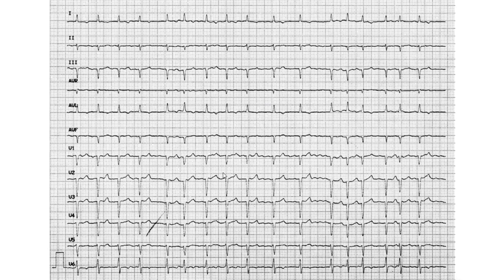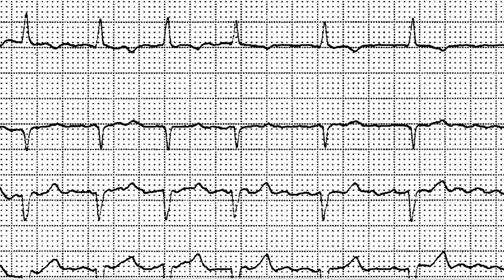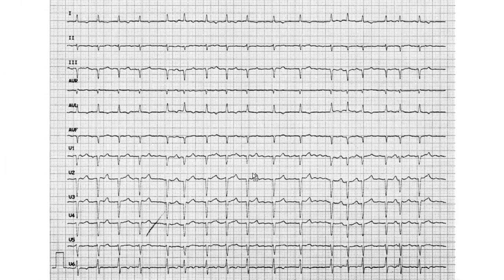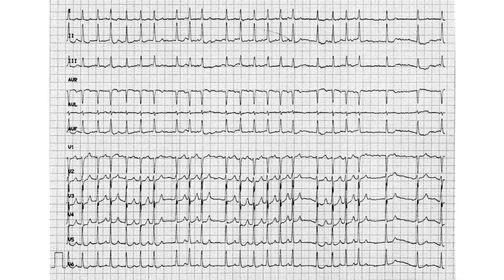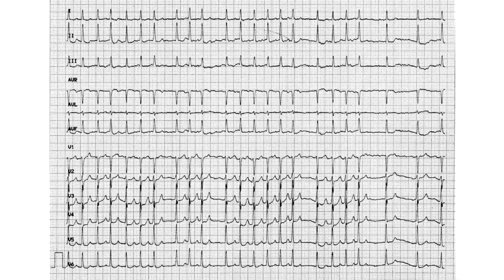Okay, so point 3, tachycardia. Point 4, you highlight what the number is for tachycardia. You check for the frequency, and this frequency is going to be, let's just say, fibrillation. Fibrillation frequency, yeah? Small f's for fibrillation. So 1, 2, 3. About, roughly again, 3 or 4. And that's done. We're done for that example. That's as much time as we're going to spend for that, okay? Don't calculate PQ. I'm afraid that you're going to forget how to calculate PQ, because we haven't calculated it for any of these because of our focus on fibrillation.